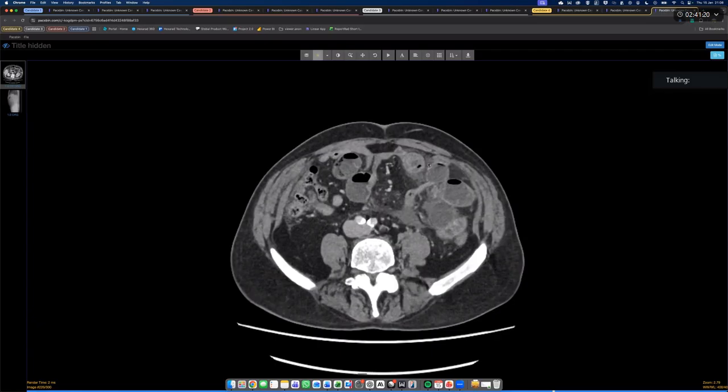We're all done. Also, about the left kidney lesion, yeah, big old renal cell carcinoma. Incidental entirely. But as most renal cell carcinomas are, diagnosed incidentally. Yes. So yeah, it was an interesting side, but not the thing I was focusing on.